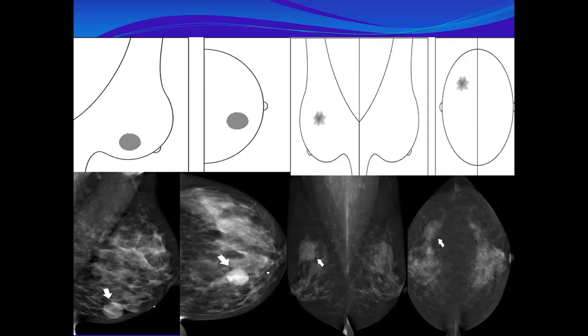Excuse me, Dr. Rabab. How could I differentiate whether it is a focal asymmetry or a mass if the mass has an irregular shape? If it has an irregular shape, I think some borders will be concave. Yes, you are right. We have seen that before.